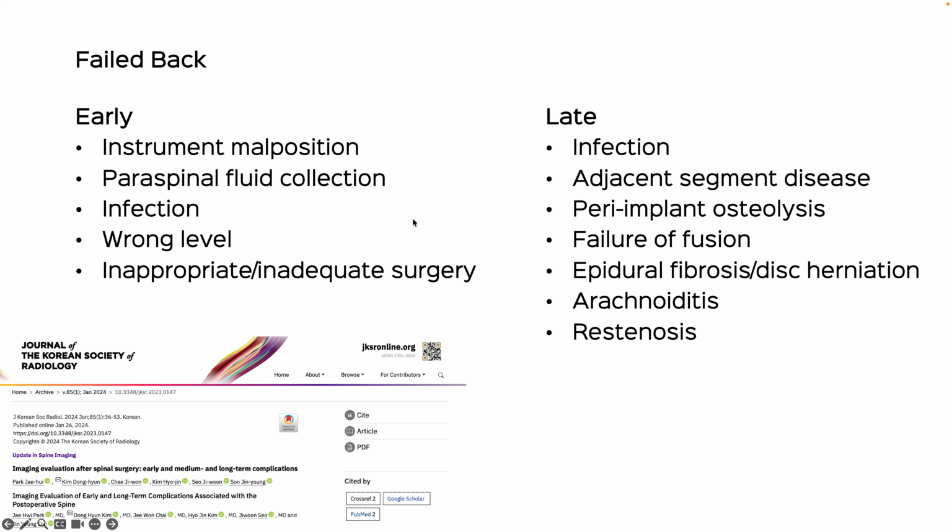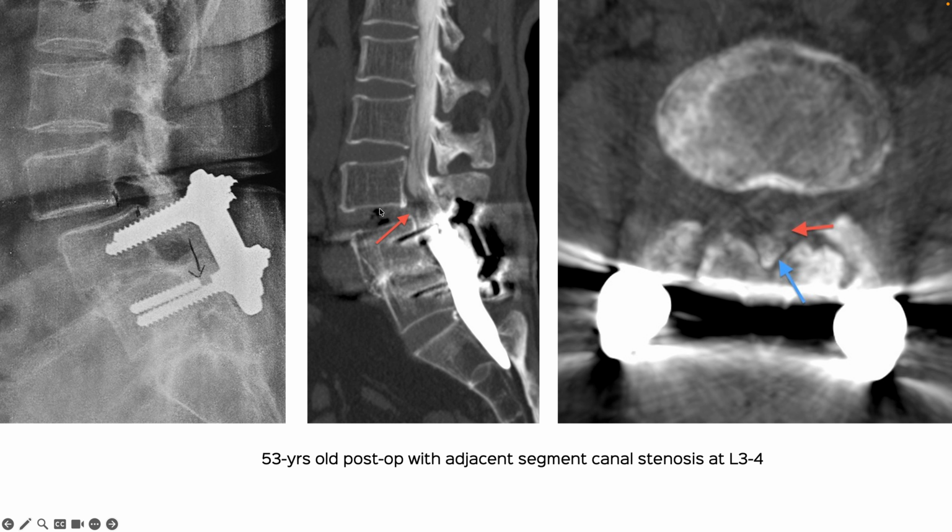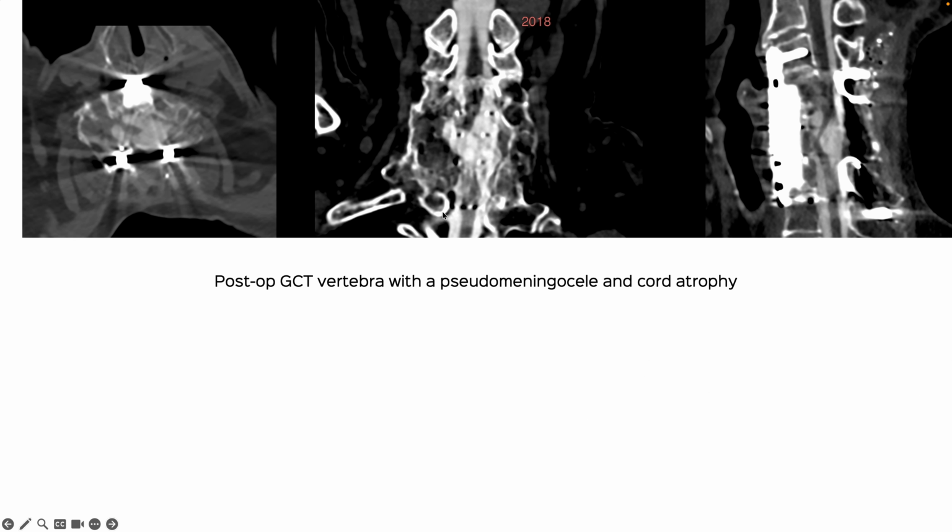If you remember, I did a post, I think last week or 2 weeks back, on epidural fibrosis entrapping the nerve, and I talked about the causes of failed back syndrome. And one of them is adjacent segment disease. So this is adjacent segment disease at L3-4. There's anterolisthesis. And you can see on the axial image significant thecal sac compression on the CT myelogram.